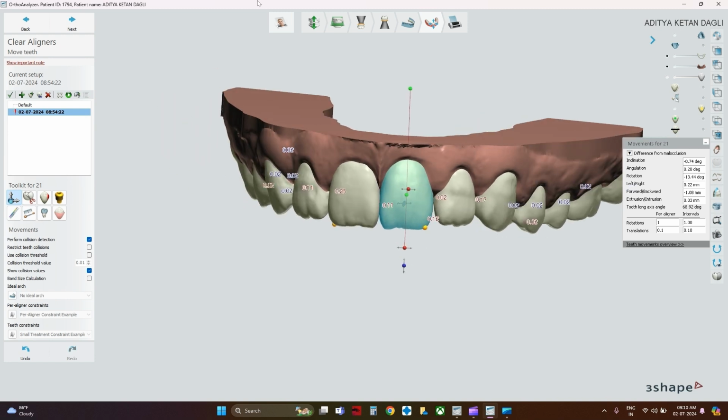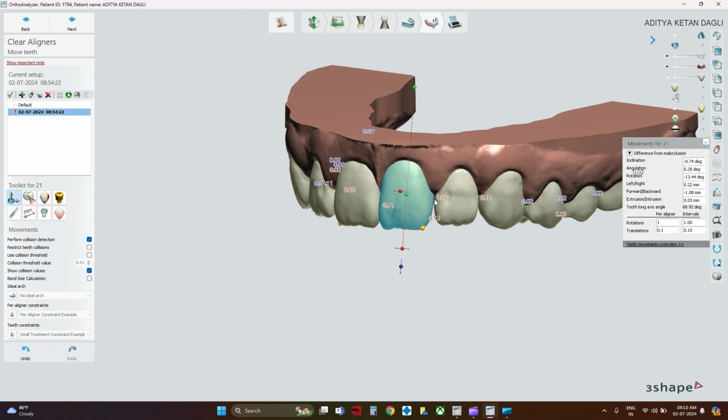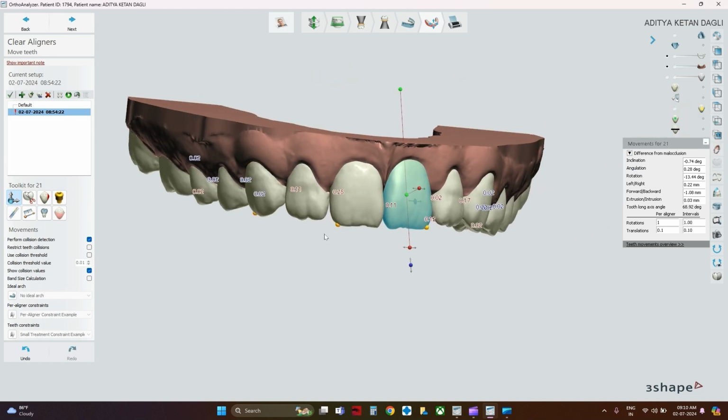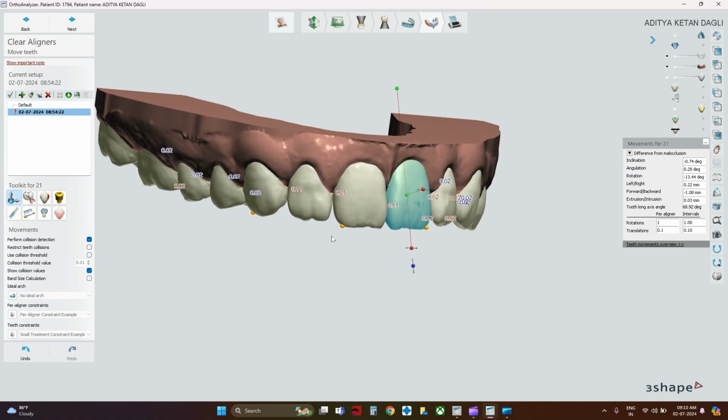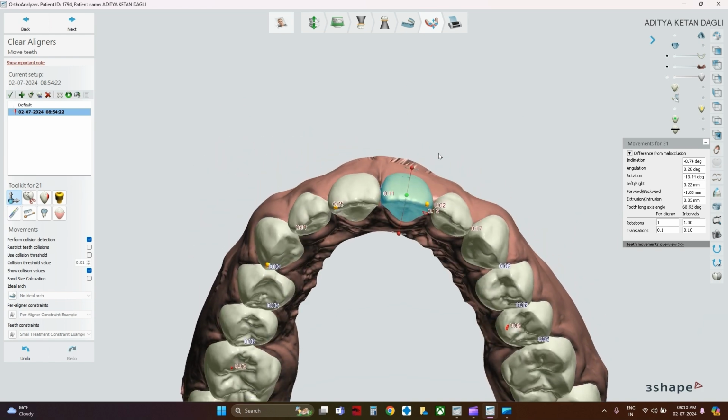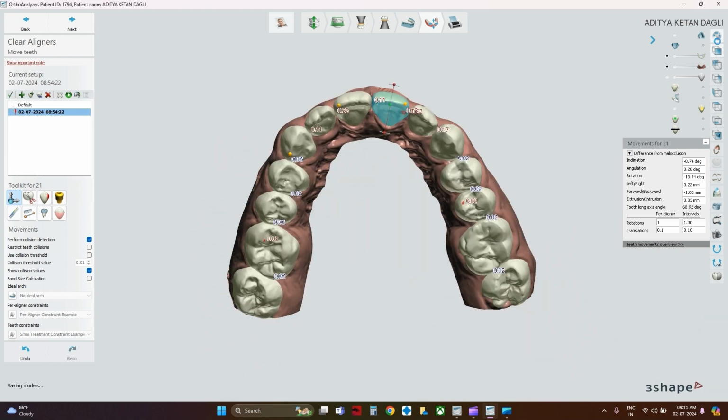If you notice, this patient has more or less ovoidish teeth, which is giving a contact point over here. There's no point pushing these teeth against each other because that's how the morphologic anatomy of the tooth is. The moment the tooth makes contact over here, it's not going to close anymore. So there's no point pushing it. We as clinicians need to realize these things.